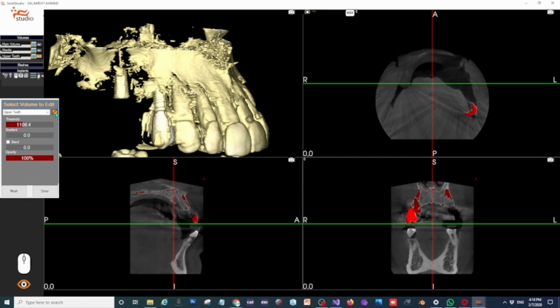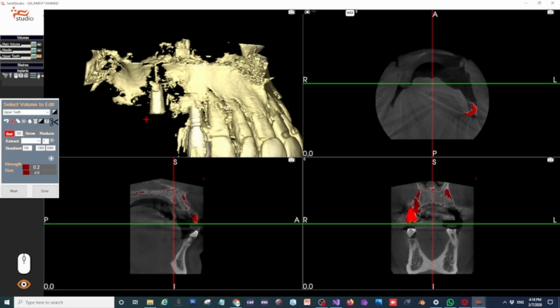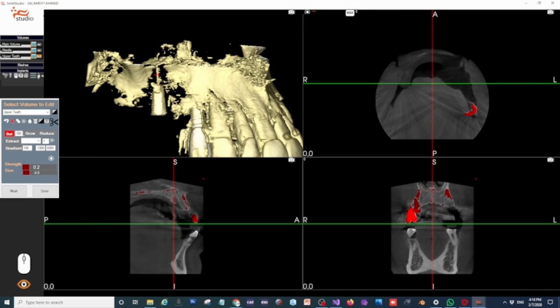Deactivate the threshold icon to reveal the editing tools located beneath the volume list. Select the Edit Volume icon to open the Parameters panel. The primary objective of these tools is to remove unwanted structures, such as dense bone, from our volume. While some areas show a clear distinction between bone and teeth, others feature bone that is highly integrated with the tooth structure. To handle this, we will reassign the voxel values of the unwanted structures to a level well below our visibility threshold. In this case, we will set them to a value of 100.